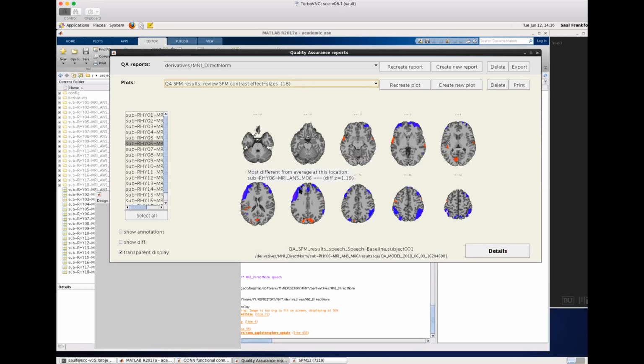That is just how it looks. You could also look at the temporal profile and identify components, like from an ICA, and you will see that it has a high frequency temporal component. The changes in the signal are typically higher frequency than the activations that you typically care about, which look more smooth over time.